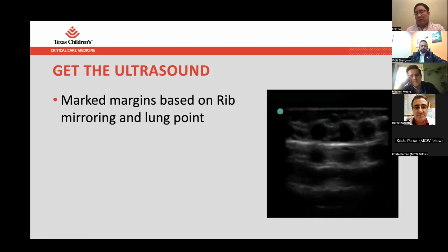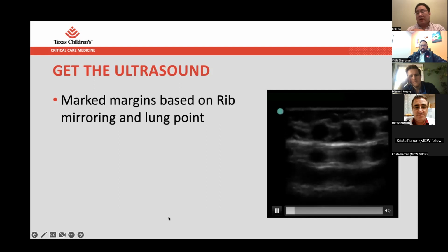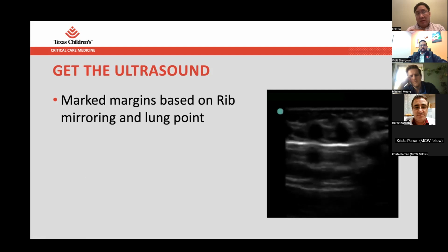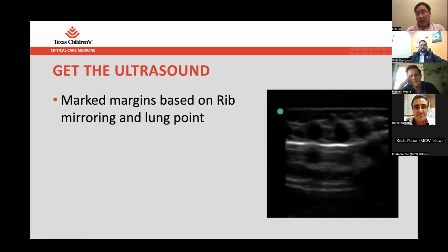But I'll tell you, sometimes the mirroring signal is a little more subtle, and it's not necessarily a pneumo. When you have this perfect mirroring, it's a lot more suspicious. And then we had the X-ray that wasn't telling us anything. We had a surgeon at the bedside. We had a kid who's desaturated to 75%. I told the surgery fellow, the only time we ever see this is a pneumo, and it's right there.